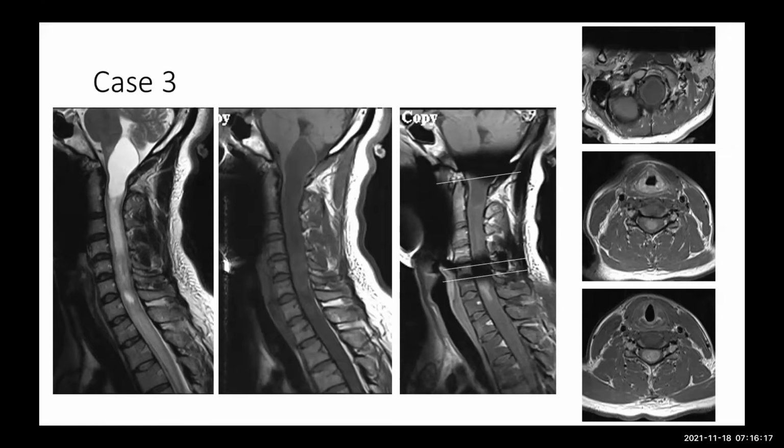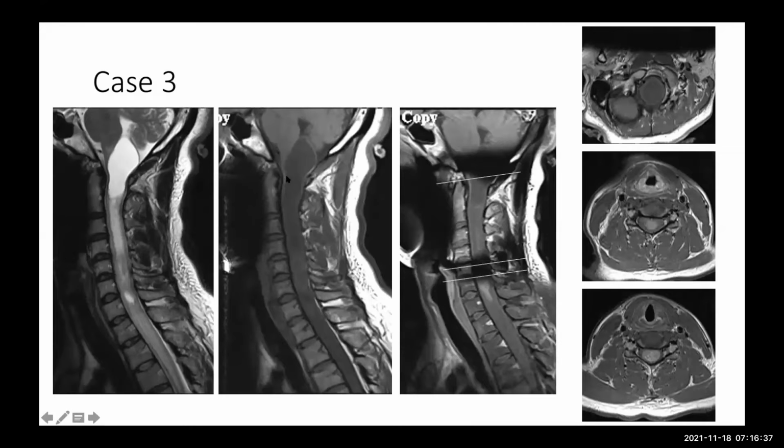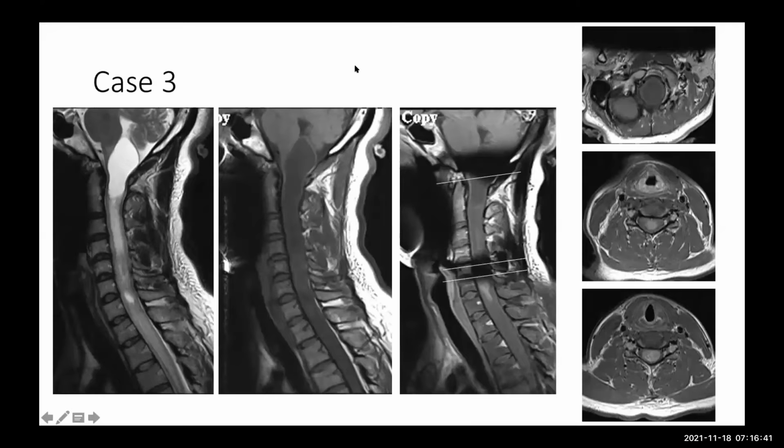So you said intradural, intramedullary, extradural, and then there's one more. Intradural, extramedullary. Got it. Okay. So what category of tumors do you think this is?